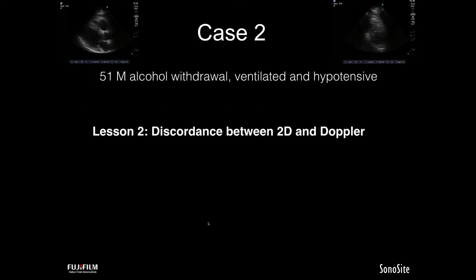So, the easy thing to do here is administer volume for this patient and repeat the study. And the key thing here is that by doing Doppler, we gave ourselves information that wouldn't have otherwise been available. Because rest assured, this patient had an IVC ultrasound, and it was indeterminate, of course, because he's spontaneously breathing on a ventilator, and most IVCs in those patients don't give us the signal we need to identify hypovolemia. So this patient benefited from volume, and VTI, of course, went up.